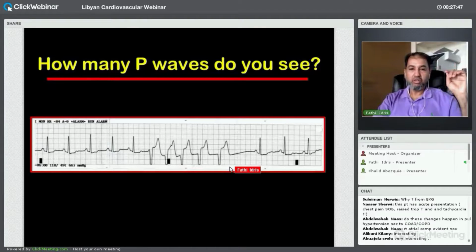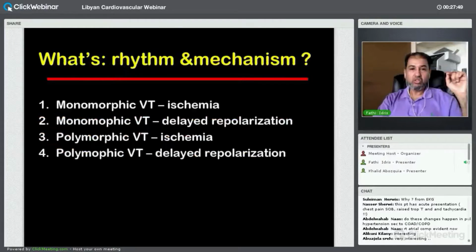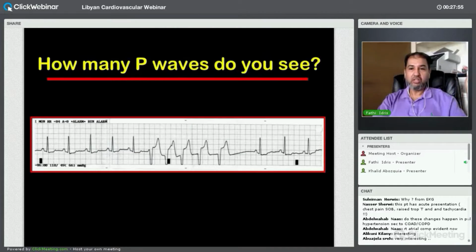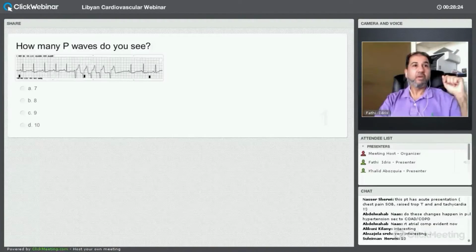That's it. So I'm going to give you the choices. Sorry, I skipped to the next case. So the choice is 7, 8, 9, or 10. So let's go back, count. I'm going to give you the thing to vote here. Okay, good. So how many P waves do you see? 7, 8, 9, or 10?